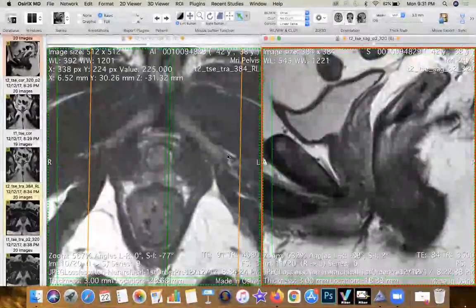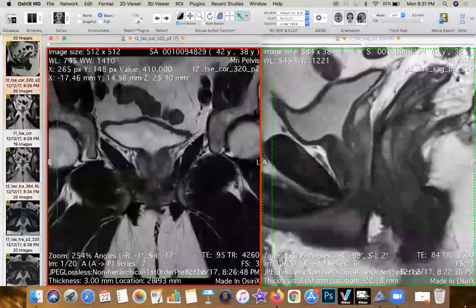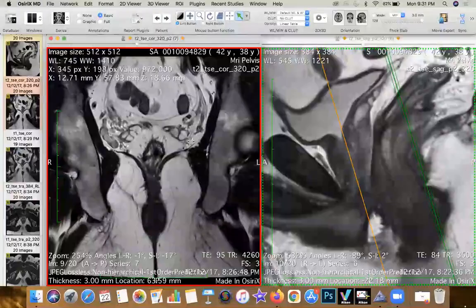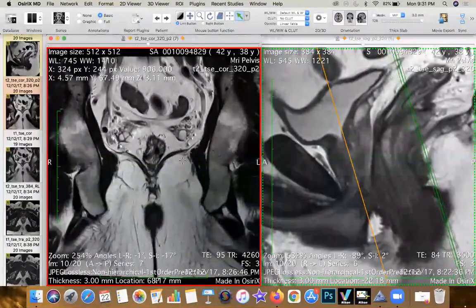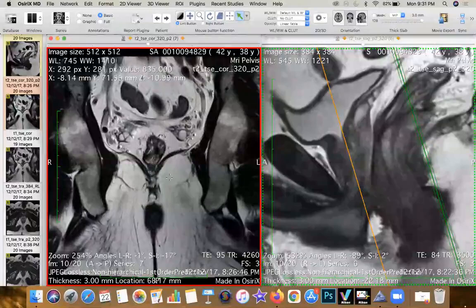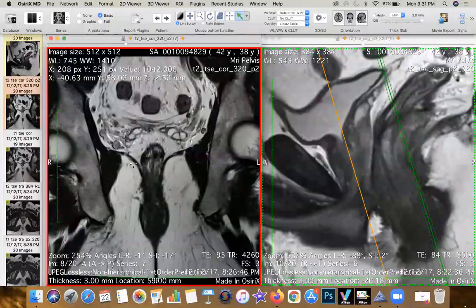Let's go to the next compartment, which is located out here, which is the anal triangle or the anal compartment. In the anal triangle, you actually want to identify three muscle groups independently. This is going to take some portion of the lecture itself. We will divide this into three integral structures. The first structure, which has the umbrella appearance that you can see out here, is the levator ani complex.